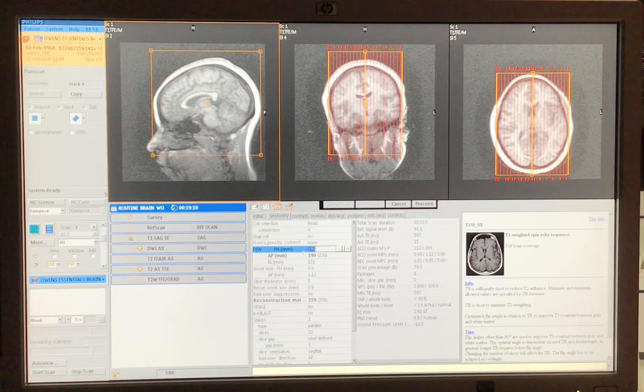So this is where at some point next semester, I'm going to be telling you, pick your own field of view. What do you like? What do you think would be a good field of view? Notice that as I go with the smaller field of view, I'm going to go ahead and decrease this signal here. This is my relative signal percentage, okay?